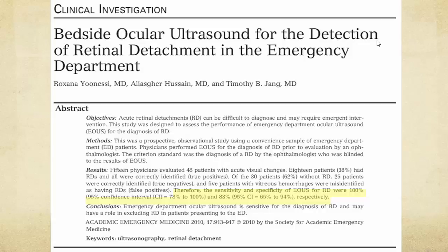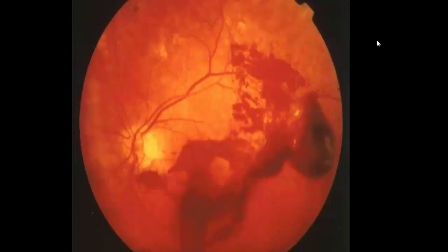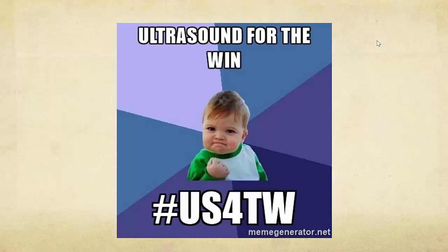So again, this is why I was emphasizing those points. If you think you have a retinal detachment, you want to look for those attached edges on the hyperechoic membrane. And then additionally, remember that ultrasound is going to be an adjunct to your H&P. So you still want to attempt a fundoscopic exam. And obviously if you see this on your fundoscopic exam, that's going to make you think vitreous hemorrhage, not retinal detachment. So you've got to take it all in context.